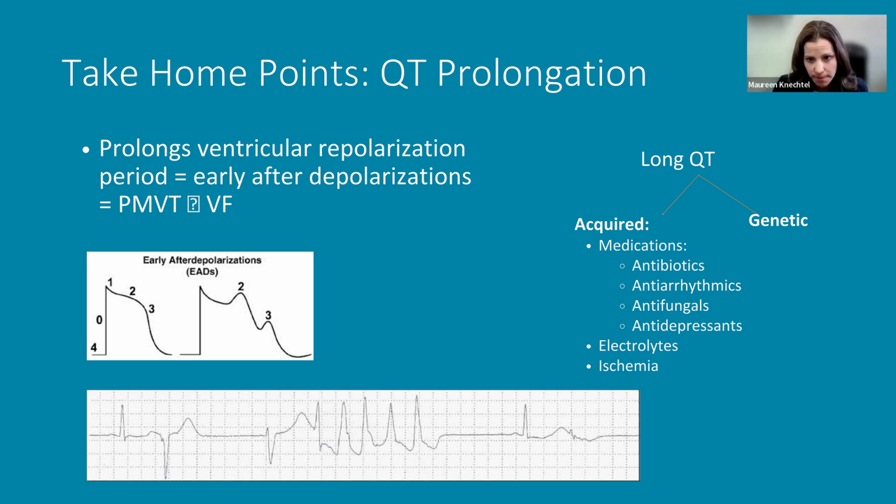And we're talking about milliseconds, but just prolonging that relative refractory period just enough. When we prolong that QT, prolonged ventricular repolarization, we create electrical instability in the ventricle. And this is what happens. So the previous EKG was one of my patients. And then this is what happened on telemetry. She was actually in the hospital, which made it much more convenient. But she started doing this later that day. And so what you'll see is you can hopefully appreciate the QT here without another normal beat after, but this is a long QT. So that's literally reflecting this happening here.